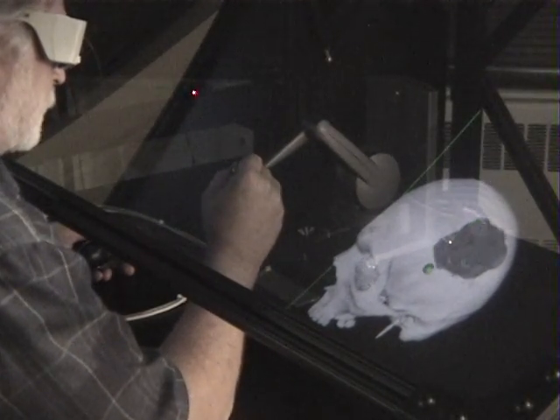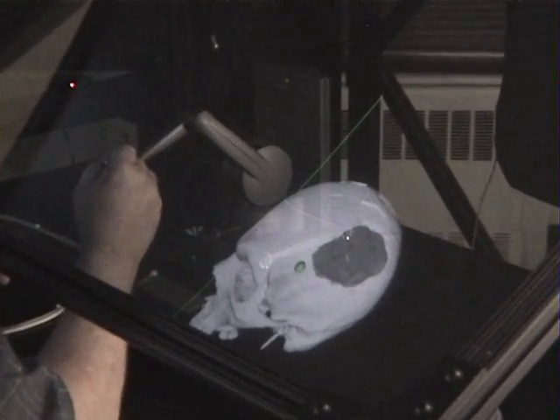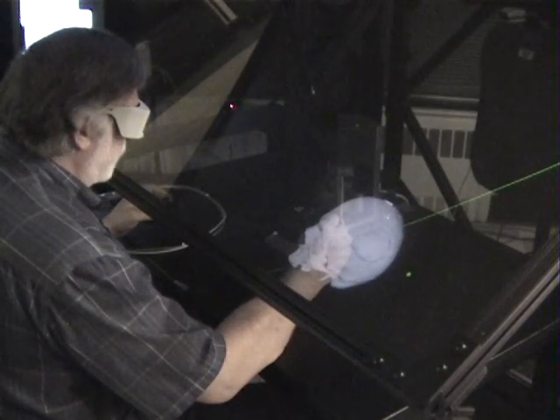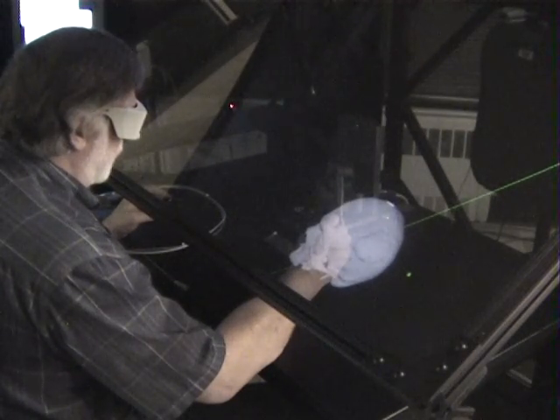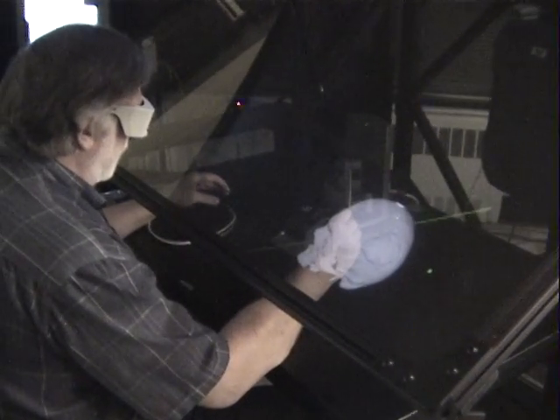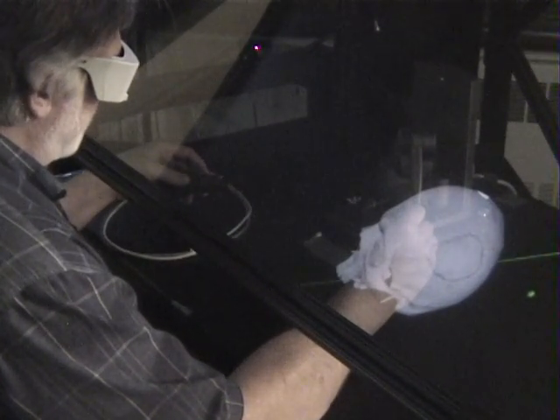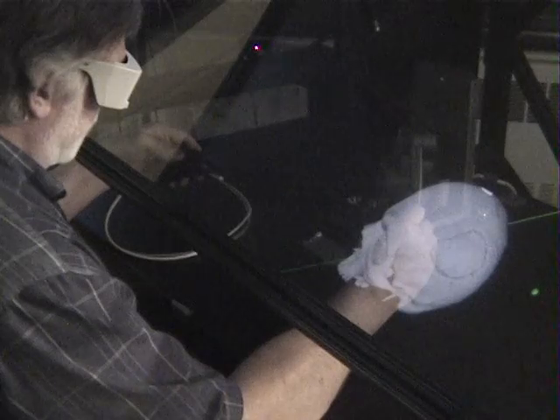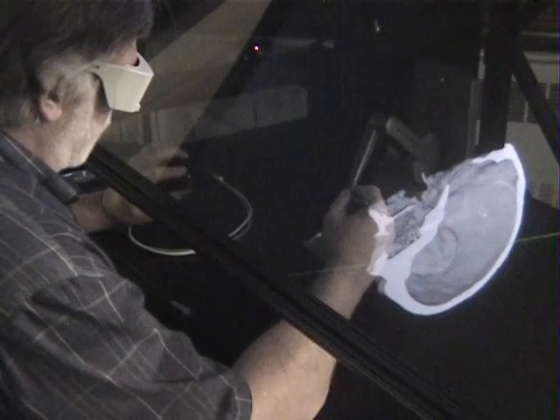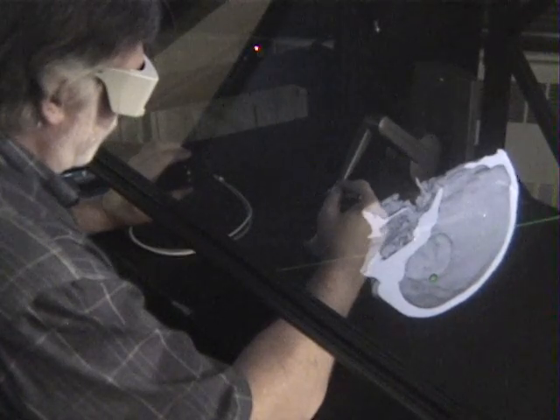So we would work at this until we have a nicely smooth surface, and then move on to the next tool. Well, we've spent some time going back and forth between the various tools, and now have what I find to be an acceptably smooth, well-formed implant. And the next step is to remove it from the defect. And in the process of sculpting, the implant actually gets caught in undercuts on the inner surface of the skull.